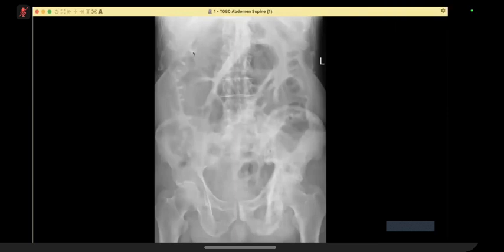Okay. I'm presented with the frontal abdominal radiograph of a 90-year-old male who presented with abdominal pain. At first glance, I can see that there are multiple dilated bowel loops. I'm trying to look for any free air. I don't see any obvious air under the diaphragm. I can see both walls of the bowel loops in the left paralumbar region. However, I would like to confirm with orthogonal views or a CT scan. But I'm trying to look for the cause of the dilated bowel loops.